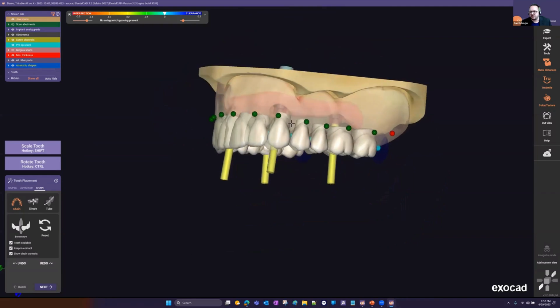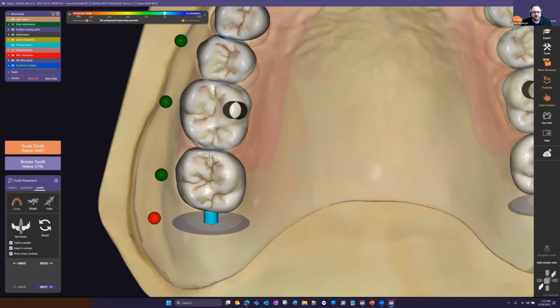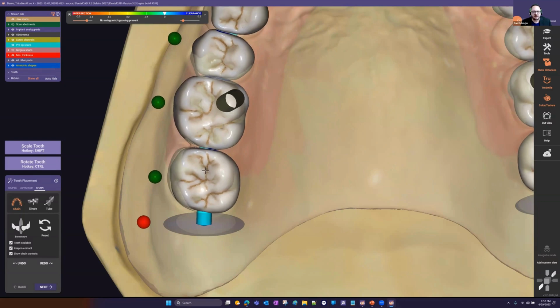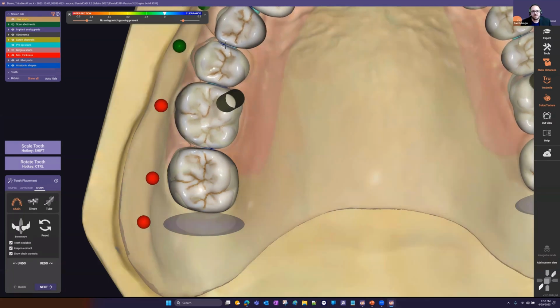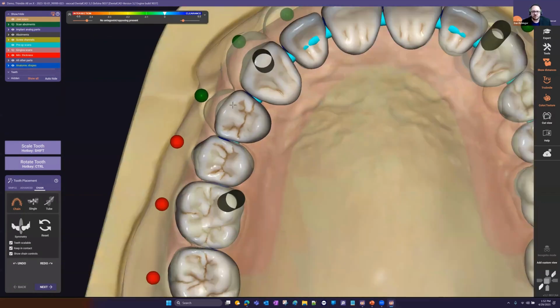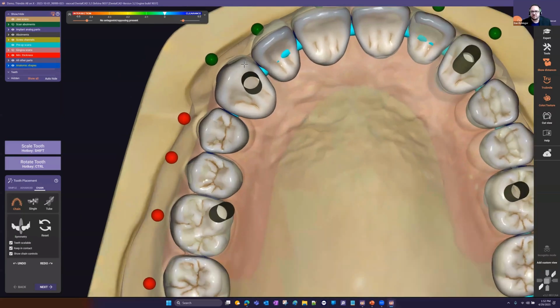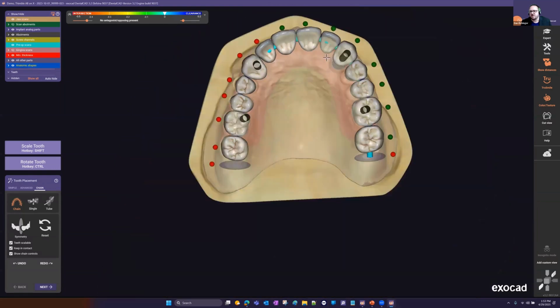And I might check height too, and we'll just use the pre-op more as a guideline. So, if you're going to match a pre-op, I'd do your tooth segmentation. But from there, I like to just left click and drag a tooth to trace my pre-op. So this is just a method. There are several videos from our YouTube channel and even other exocad experts, some of our independent certified trainers, who put out videos, but people attack chain mode different ways.